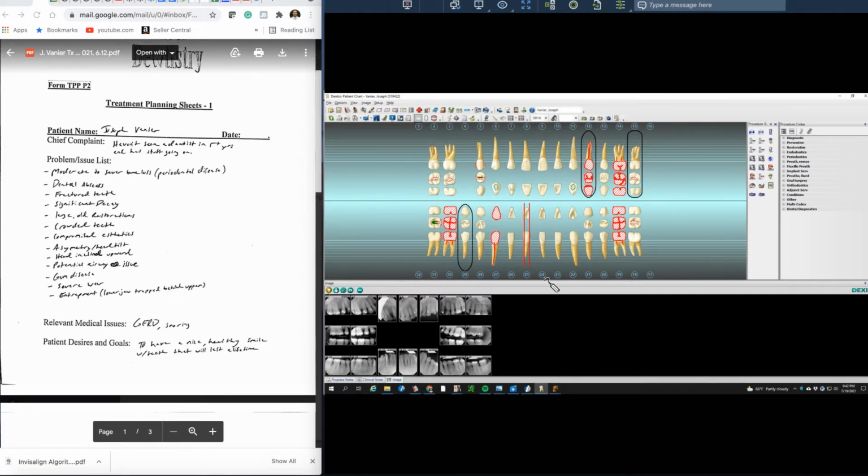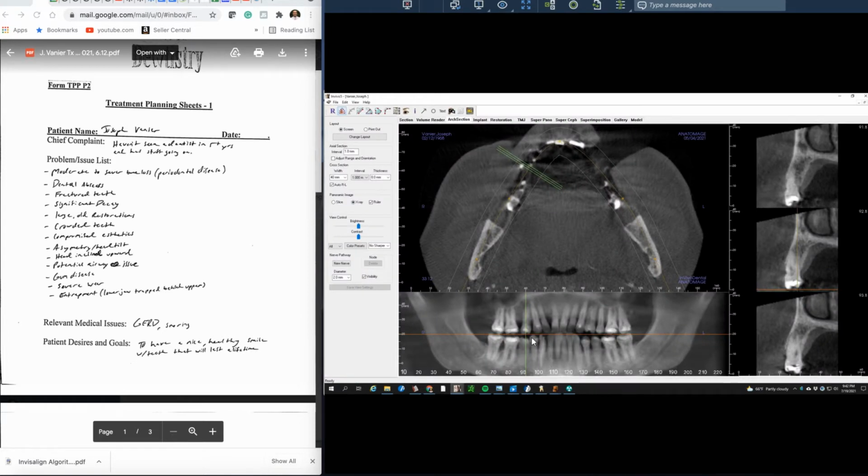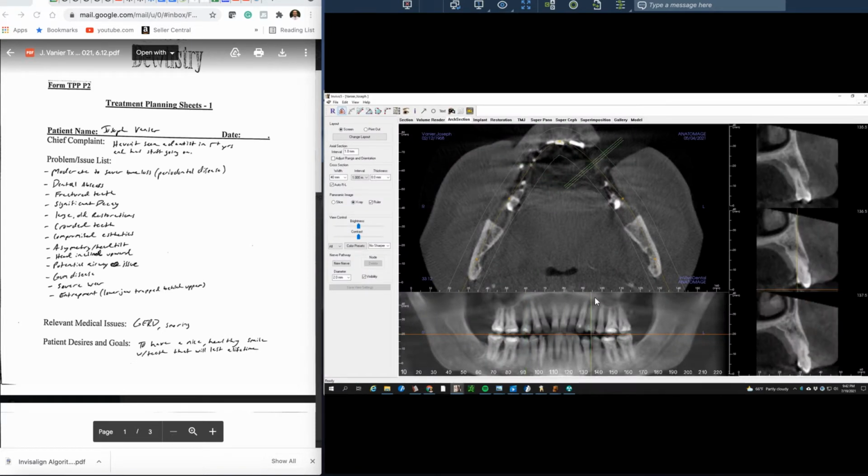Dental abscesses. You had mentioned in the email, I believe it was number 11 or 12, that does look suspicious. So let's look at our friend, the CAT scan. So here we are.